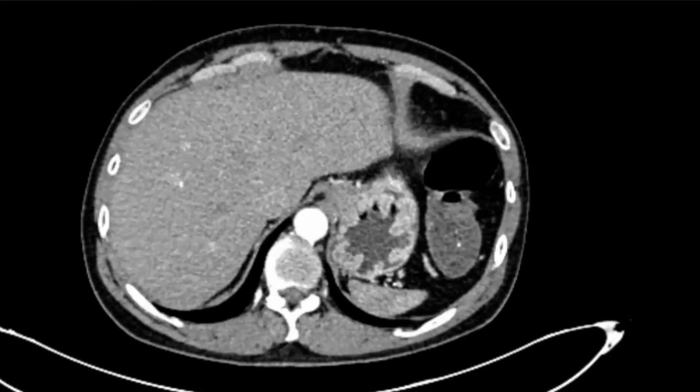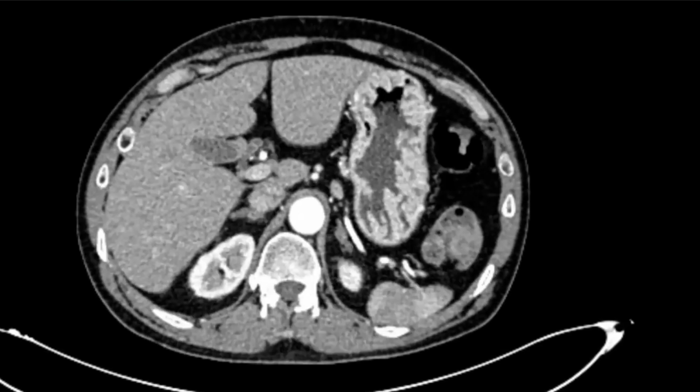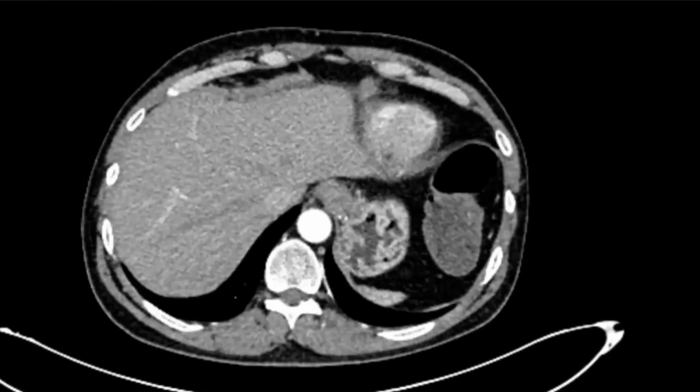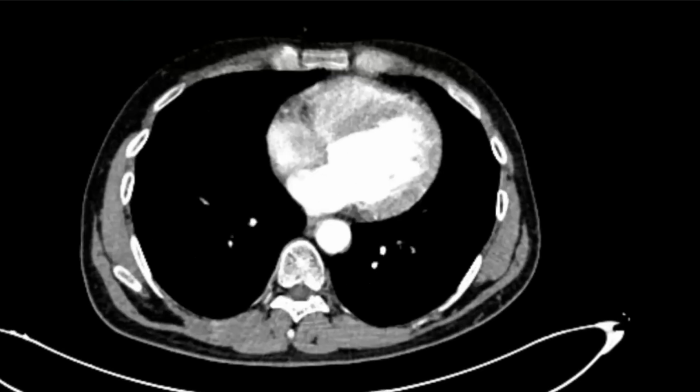If the patient is having recurrent ulcers, recurrent and very aggressive gastroesophageal reflux, not being managed by PPIs and everything, would you be suspecting anything else abnormal in the upper abdomen? Can you find anything else abnormal near the duodenal wall?